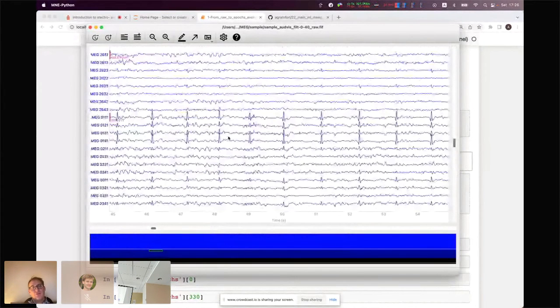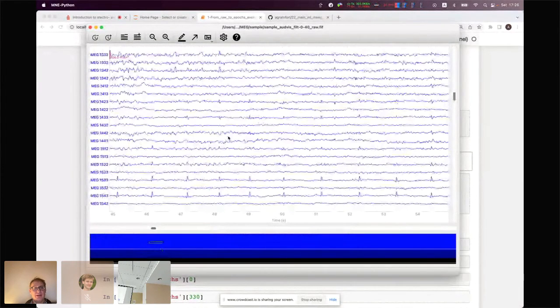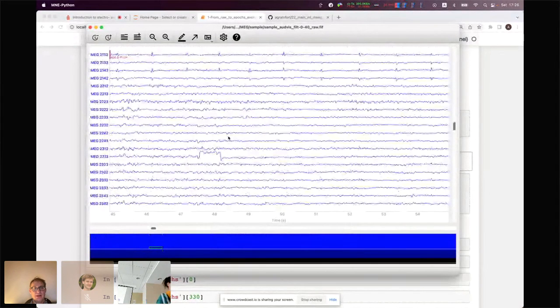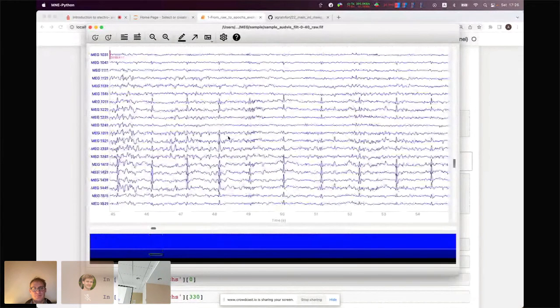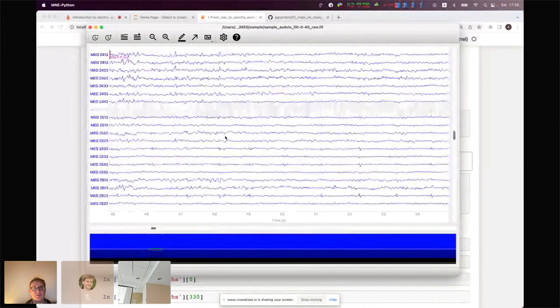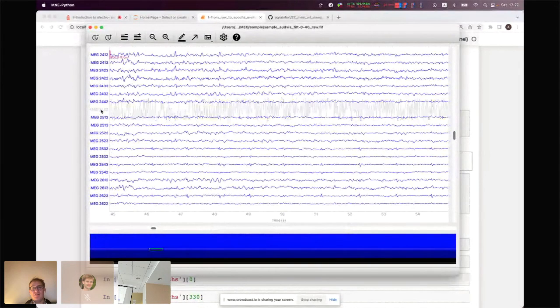All right, so let's spend a few more minutes then on the raw data. Okay, so here, these are the gradiometers. And here, if you look here, this channel is grayed out, okay? And this channel is grayed out because it's typically a bad channel, a channel that was corrupted during the acquisition. And just by clicking on the label here, you can toggle, you can remove this channel and mark it as bad, okay?